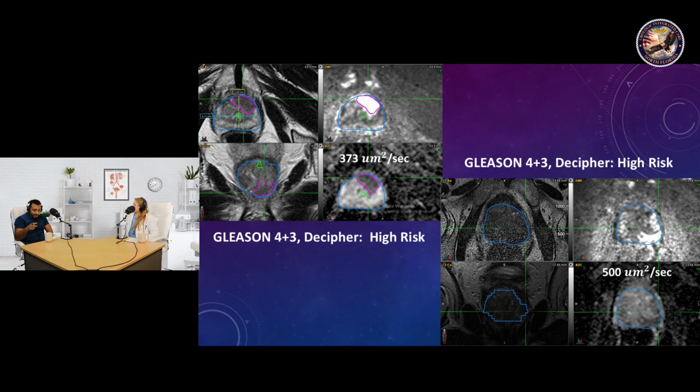And you can definitely tell with the T2 weighted image there's definitely pollution of noise, whether it be supplementation, like iron supplementation. Sometimes when patients take that, it might corrupt the images. But maybe it's an older scanner, maybe it just wasn't as good, or the Faraday cage wasn't good enough, or had a little leak. So tell us a little bit about the Faraday cage, so people know.